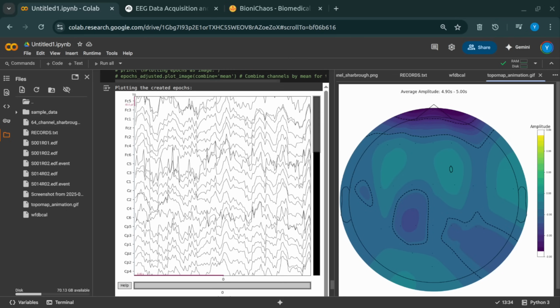The time value we extracted for this T0 seemed really unusual. It didn't look like it was representing a typical event onset time, like the start of the hand movement thought. Exactly. And that no data error we kept getting further screamed that this T0 in the .event file wasn't what we needed to segment our data effectively. It wasn't the marker for the task itself. So you hit another wall.